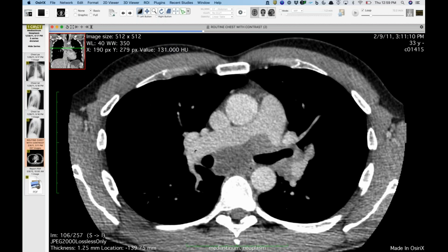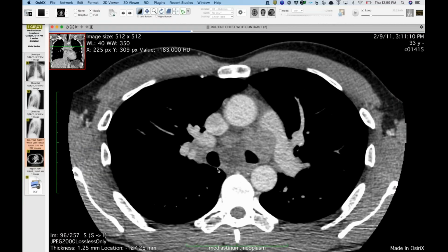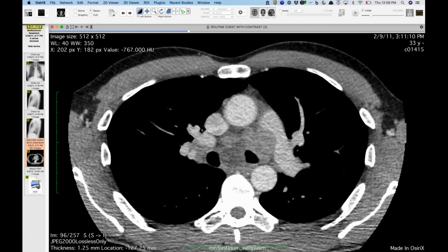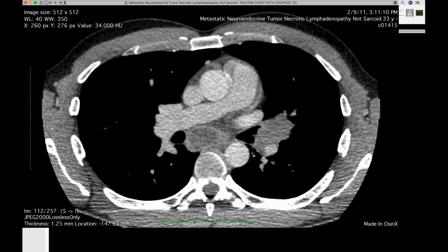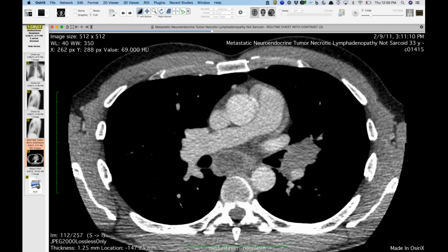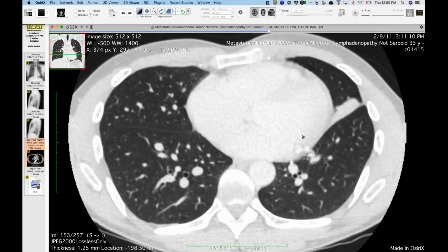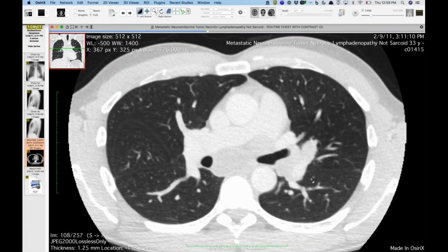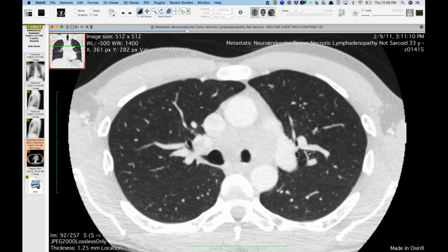I found there's old literature, more from radiography than CT, talking about the distribution of sarcoid lymphadenopathy and how it's almost always symmetric bilateral hilar with subcarinal and paratracheal, the typical 1, 2, 3 that you see. So this was a lung primary, presumably. Presumably, yeah, it was a carcinoid of lung primary, and I'm guessing it was somewhere in the left lung given the asymmetry of the hilar involvement. But as you can see here, not really, unless it was in a lingular bronchus to start, because that's the only airway that's being taken out there.